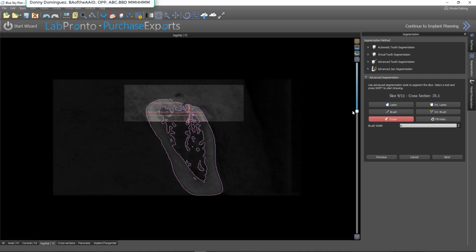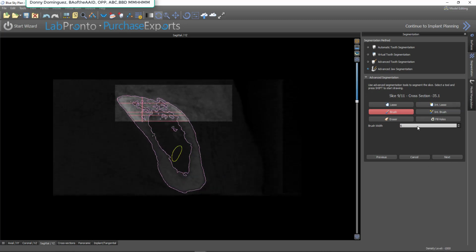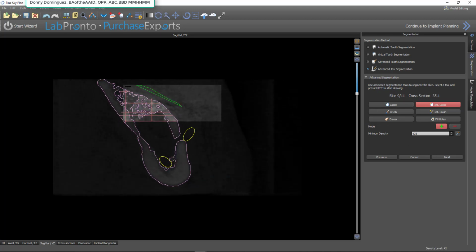And I'm just trying to think in 3 dimensions of what would give the computer the most data points to fill this in properly, so I don't have to keep coming back and redoing this and redoing this. So I'm going to get just a few slices in this area. Notice again, very little effort, because the fill hole functions work better having the outer boundaries defined.